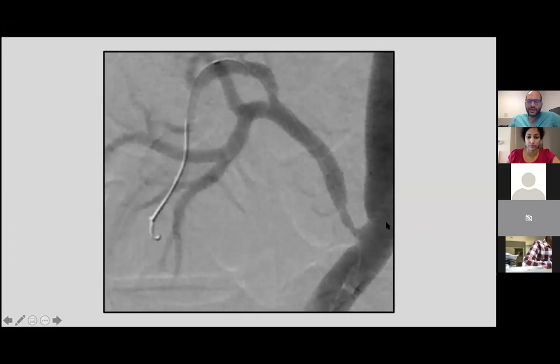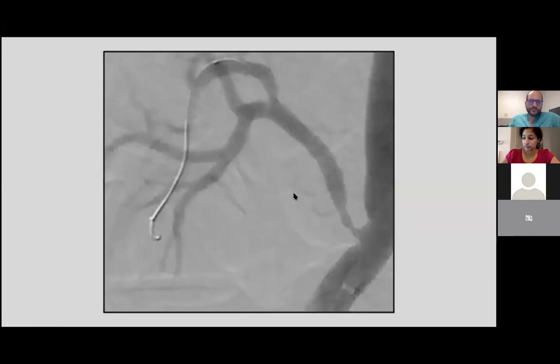So in this particular case, this was the transplant renal artery stenosis. You can see the stenosis right here. So you're going to get the normal kind of waveform proximally, then you're going to get the plug waveform, and then distal to that, you're going to get spectral broadening. You're going to get that turbulent waveform.